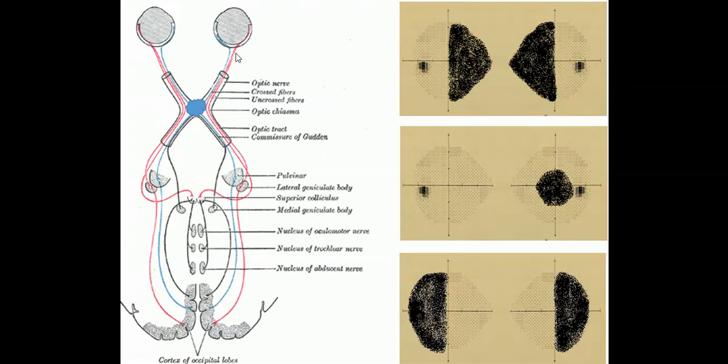Well, here we have the nasal fibers that are being affected, but don't let that fool you into thinking that it's the nasal visual field that's affected, because again, everything's reversed. The fibers that are on the nasal aspects of each optic nerve take vision from the temporal fields, and so our correct answer is the bottom one, and this is the well-known bitemporal hemianopsia. I've shown a dramatic example where the whole temporal visual field is affected, but in most cases that's not what happens, and we'll discuss that a little bit later, where only part of the temporal visual field is lost.